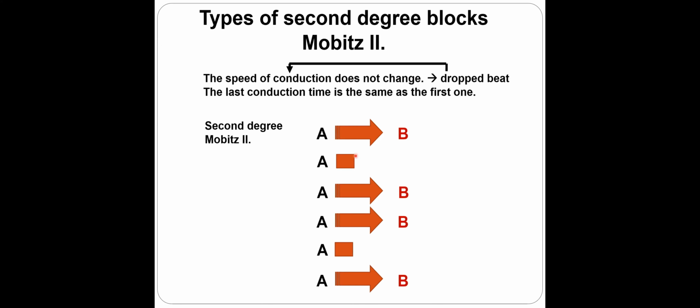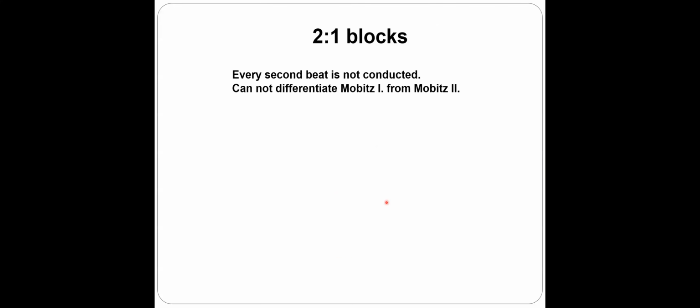It means there is no gradual slowing down. Whenever we conduct, the conduction speed is the same, and sometimes we have a dropped beat. This again is not a rhythmic one.